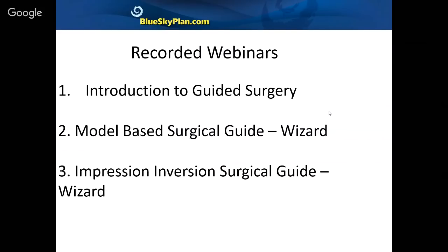The second presentation talked about how to treatment plan and create a surgical guide for a model-based surgical guide that's using an optical scan of a model, and we demonstrated that in the wizard process flow. And the third presentation demonstrated how to plan and create a surgical guide using the impression inversion technique, otherwise known as the Ferguson technique. And we demonstrated how to use the wizard to go through that process flow to plan and to create the surgical guide.